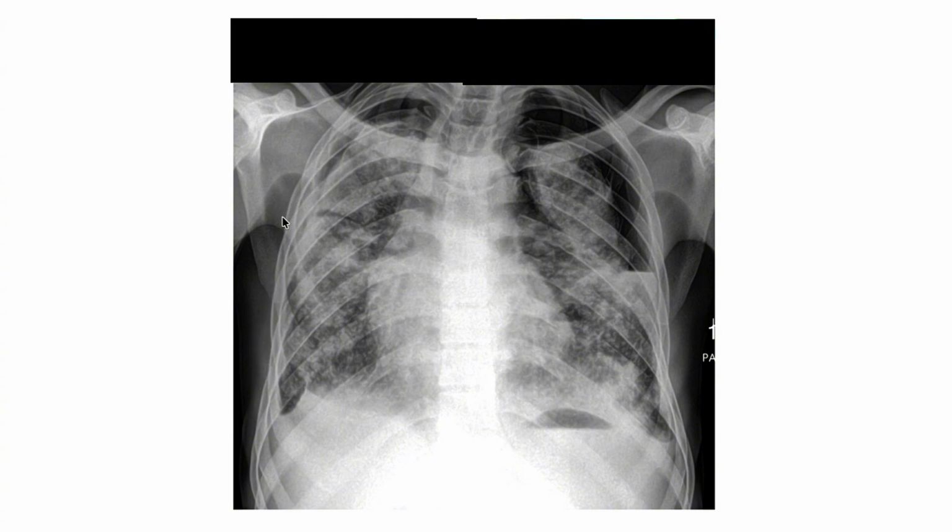We can look at the bony structures of this chest wall. And of course, we go inwards. You see, I'm trying to interpret from outwards, inwards. I've looked at the bony prominence, and the hemidiaphragms, then the cardiac shadow and the mediastinum, then finally the lung fields.